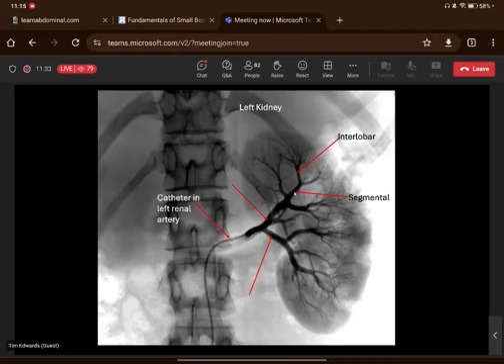But I think this is certainly fair game when we start getting into where the renal artery becomes segmental branches, and then certainly when they become interlobar branches that run adjacent to the medulla, the medullary pyramids. And then, as we can see in the cortex, these smaller vessels are the arcuate vessels that they eventually branch into. So, main renal artery, anterior and posterior divisions, segmental vessels, interlobar vessels, and then arcuate vessels finally.